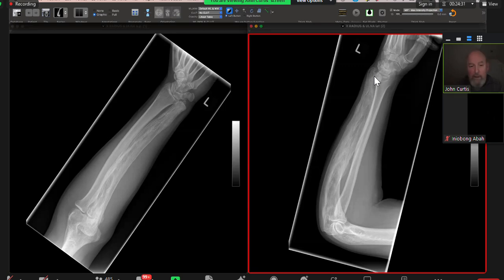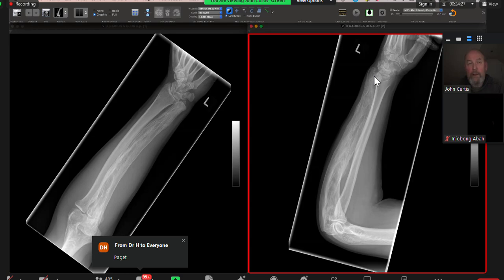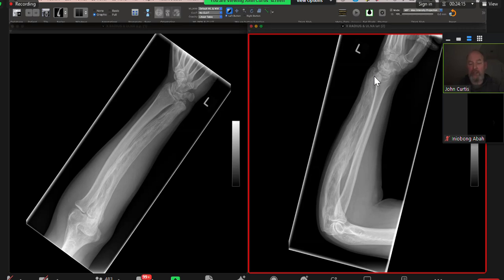At the top of my differential diagnosis, it could be due to increased trabeculation, and I'm thinking about Paget disease. Paget's, that's all I wanted you to say. So in the exam, if you know what it is, knock it for 6.